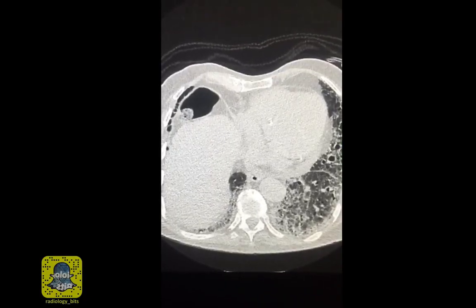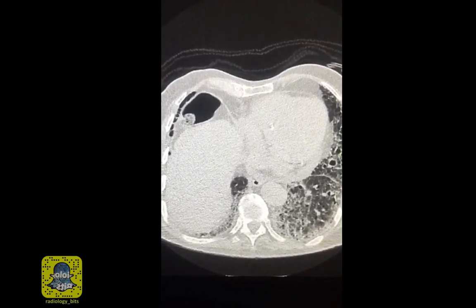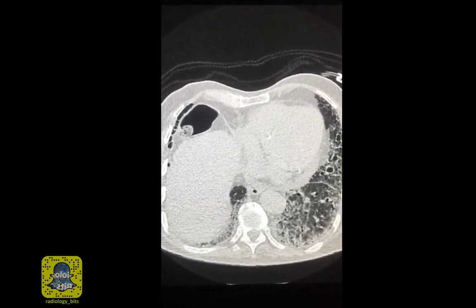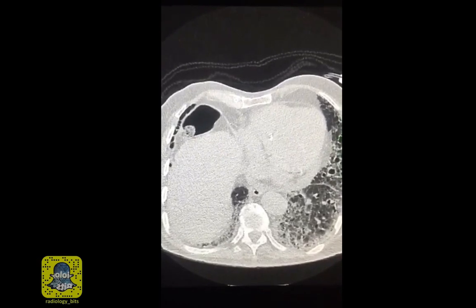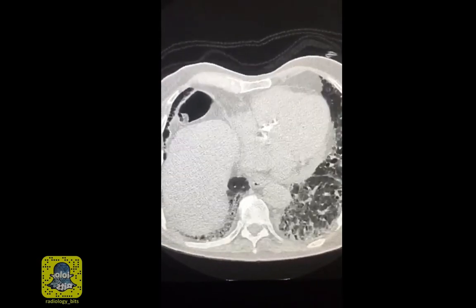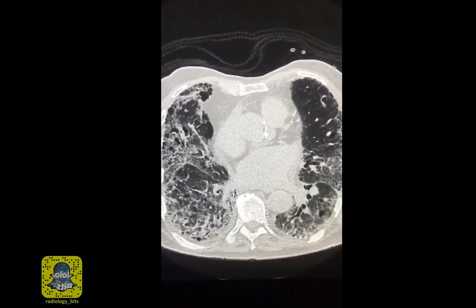Hello everybody, this is a quick case that is dedicated for seniors. Juniors, you might get something out of it as well. The reason I chose this case is to deliver a quick teaching point to discuss a misconcept that we commonly see in reports. Now this is a high-resolution chest CT on an elderly patient with lots of lung changes.